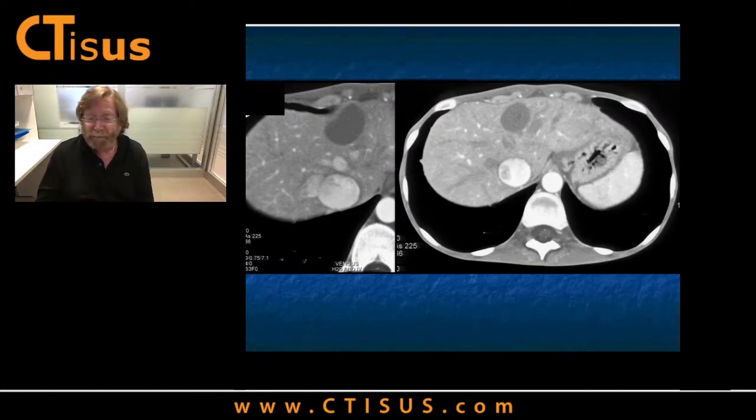This was biopsied because you say it looks like an abscess. Patient was febrile. There's definitely a mass there. Things in younger females, you think about FNH, you think about fibrolamellar hepatoma, you think about things that are all vascular. This was isodense, barely seen, low density. It's not good for hepatic adenoma unless it's something that bled. It's surely not good for FNH. What could this be? What could this be?